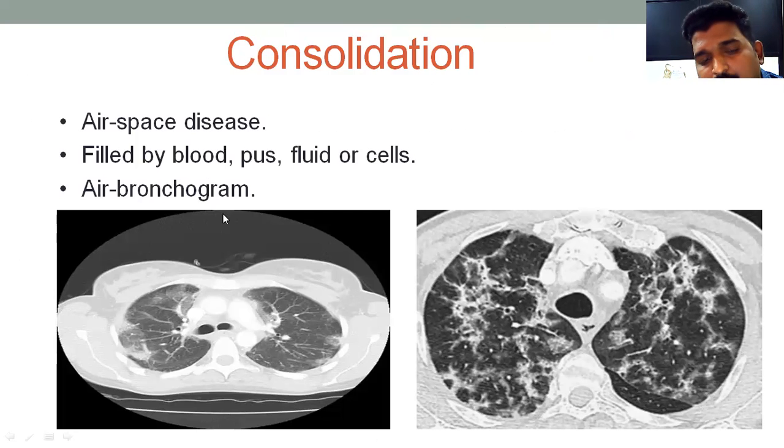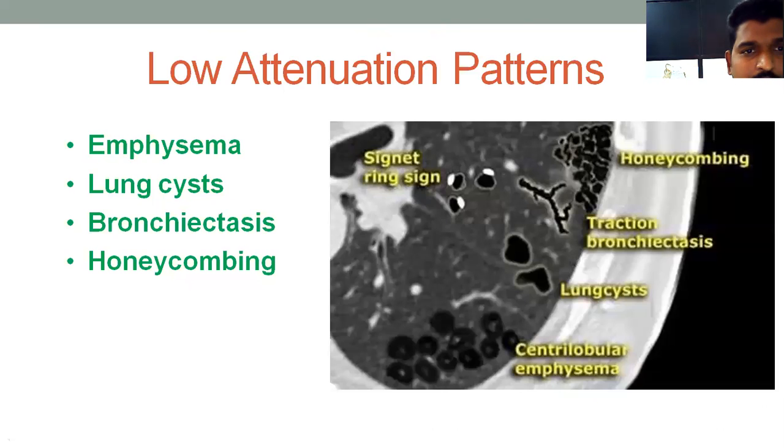Air bronchogram is described both in X-rays and CT. You could see here in the periphery of the lung some airspace opacity, consolidation, along with the ground glassing. And here you could see the same patient, followed up after 2 to 3 months. You could see that there is airspace consolidation predominantly distributed along the vessels, along the bronchovascular area, sparing some amount of the peripheries. And you could see this distribution is very close to the vessels or very close to the airways. So seen in organizing pneumonia.